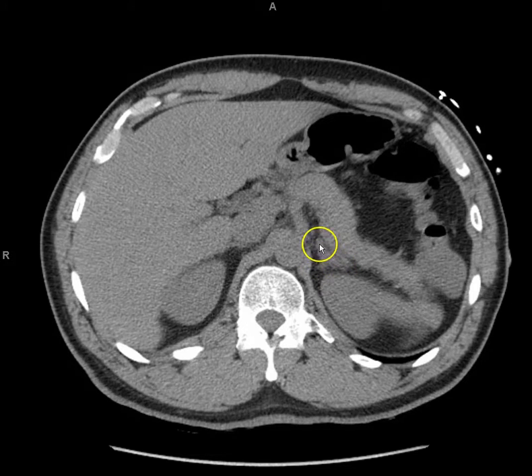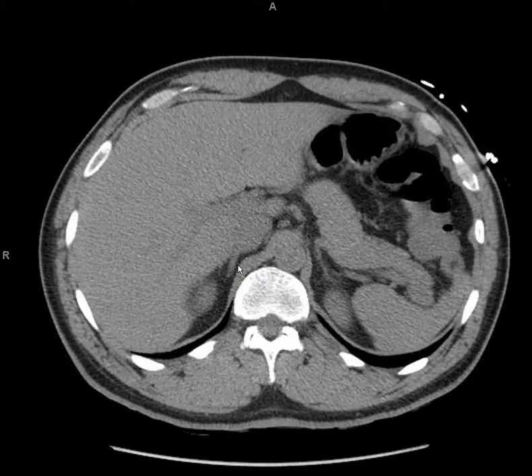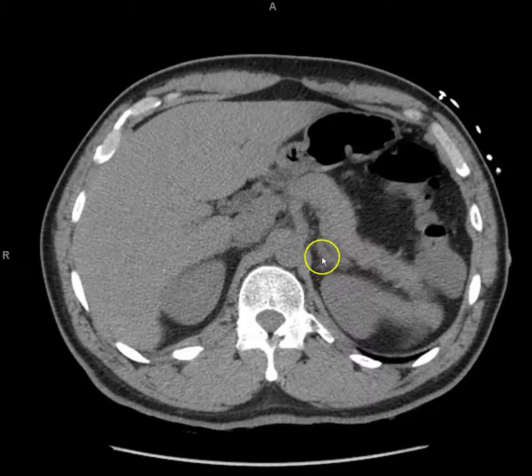Can you show us the first one again? Sorry. It's upside down. 1, 2, and then straight over. When you have contrast, it's a little easier to see it. But it's this hazy upside down V or Y shape. And you can see that here as well.